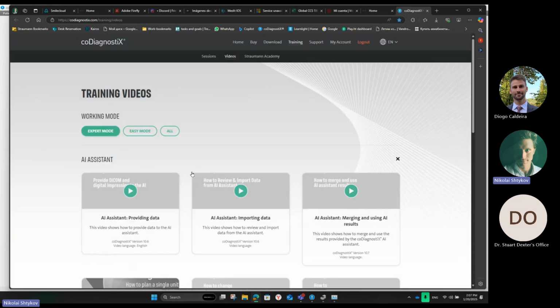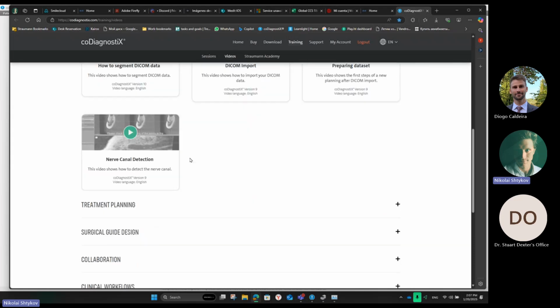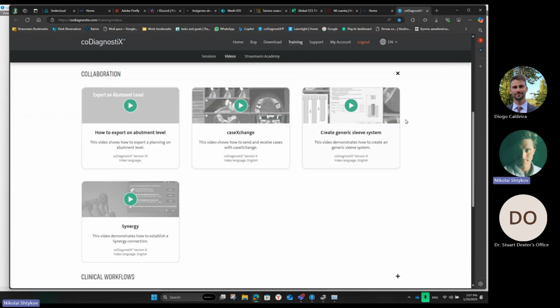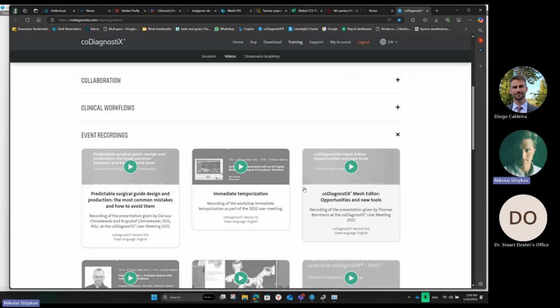Training videos, actually, from my perspective, are one of the most helpful resources, because we have different topics. You can see how to plan the case with the AI assistant from start to end. Every step we describe here. Also data sets, and for example surgical guide design. Even here we have how to design stackable guides, how to connect with the case exchange, different topics. We have a lot of answers to questions here, and also event recordings.